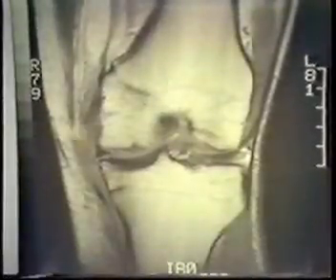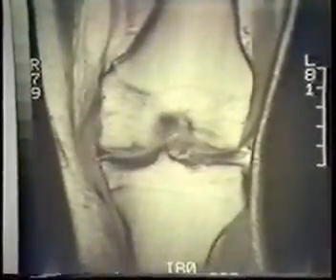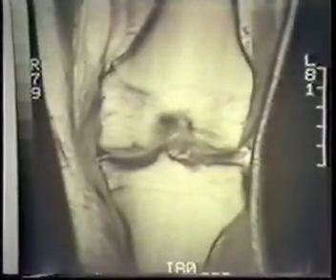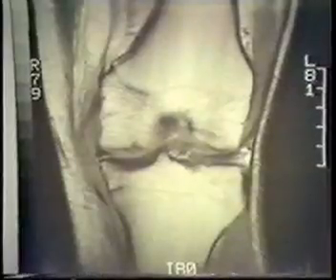When you have a tear of the medial collateral ligament, again, you get thickening, some loss of the soft tissue planes, and increased signal intensity in the area of the tear on the first echo. On the second echo image, again, you see the high signal intensity and really the location of where the tear actually occurred. We think MR is very, very accurate at evaluating acute ligamentous injuries. So far, we've done about 6,000 cases, and, well, not all those have had ligamentous injuries, but we've had several hundred ligamentous injuries, and we've been very accurate.